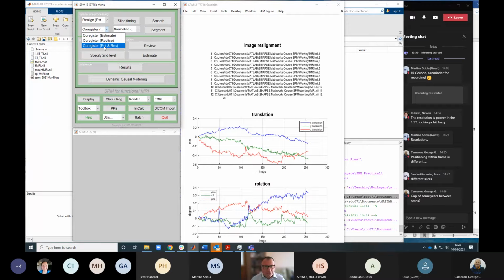so that we can use the structural high resolution information in the structural scan to help us with one of the following steps in the processing pipeline.